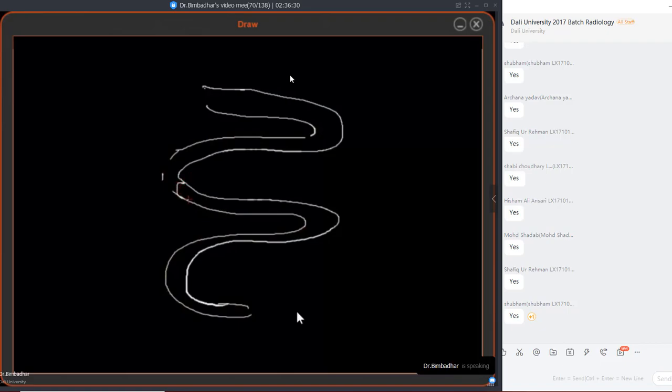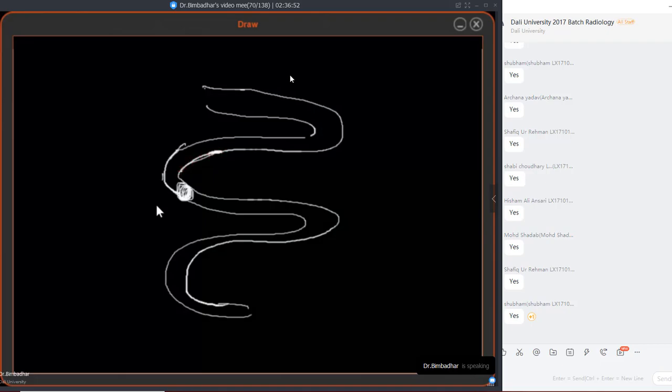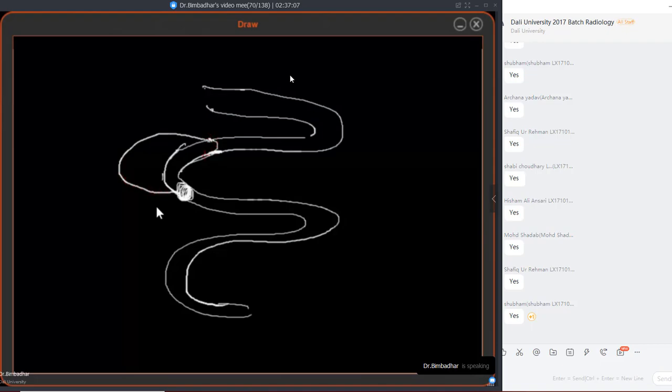Now there is a complete obstruction here. Anything present up to this level, let us say the largest resting diameter just before the onset of obstruction, let us say this is the resting loop here. Now this one will become completely abnormal. Let me draw the fluid levels so that you can understand. This whole one became completely dilated, and this is the resting one. So this one became an air fluid level, and this one here has an air fluid level here.